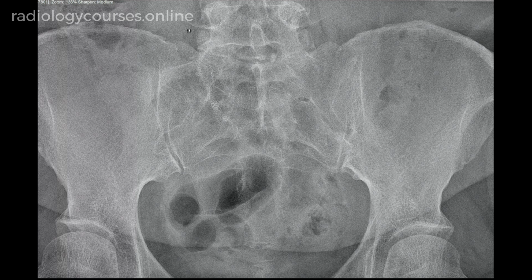Here I have a magnified pelvic radiograph of a 50-year-old with a history of low back pain and hip pain. I have magnified it to show the sacral region. What we have here is this obliquely oriented, slightly curvilinear sclerotic line overlapping along the right sacral ala.